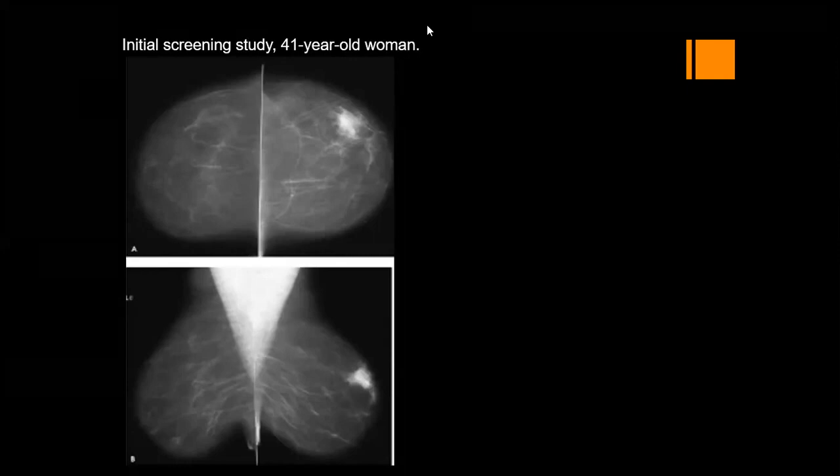I will be sure. In the CC it is not adherent to the skin, but in the MLO it is. How can we be sure the same lesion in one standard view is the same lesion on the other view?